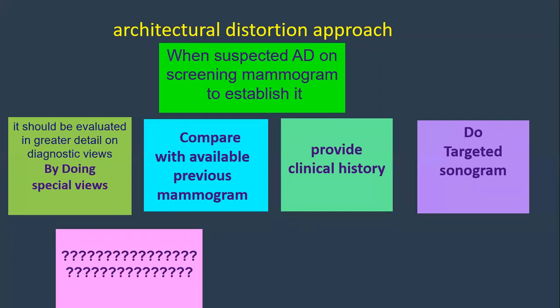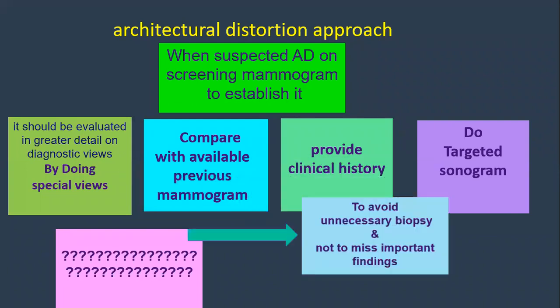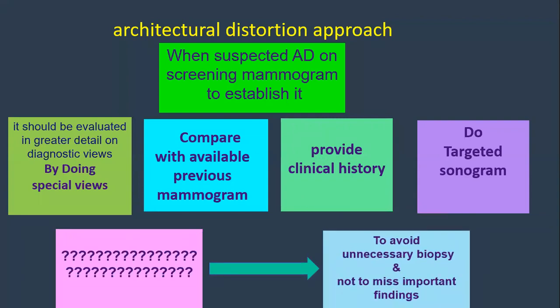So before taking a biopsy, we have to make sure. You are right: to avoid unnecessary biopsy and not to miss an important finding. We don't like to miss an important finding, and at the same time not to do an unnecessary biopsy. We have to make sure this is a real abnormality and it needs to be biopsied.